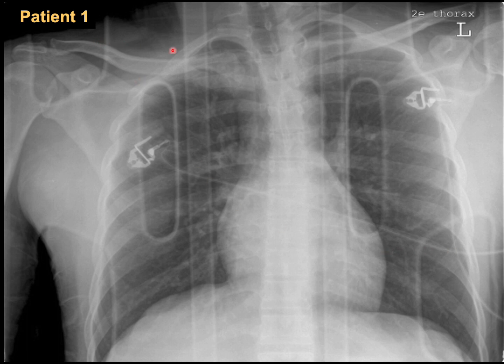Okay, I'm going to go through the airway. Airway is more or less okay. I know that you are not very happy with these shadows, and we are sure that in all our emergency departments, this is how we are going to receive your x-ray, because this patient is on the long spinal board, and it's worth mentioning that every effort must be done to remove the board from the patient before 2 hours passed. It can cause very dangerous ulcers that might lead to sepsis and septic shock even, and the patient might die from the septic shock even before his chest injury.